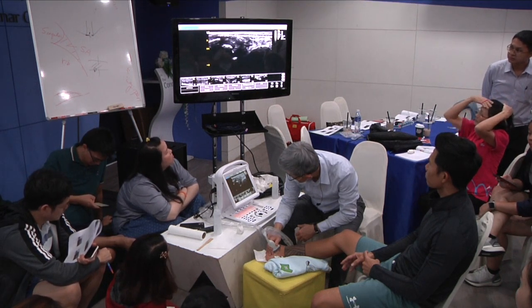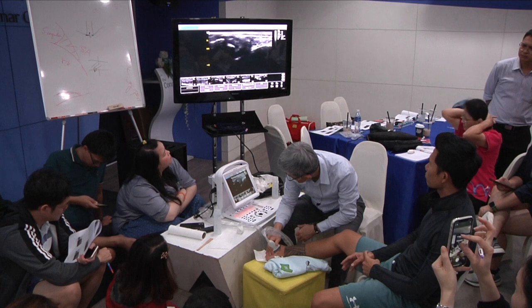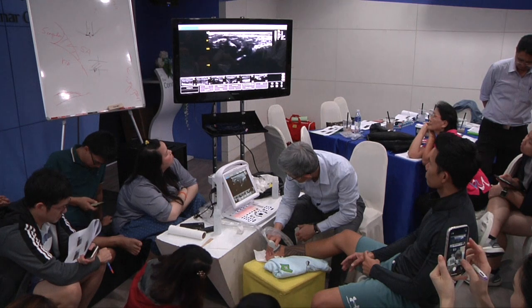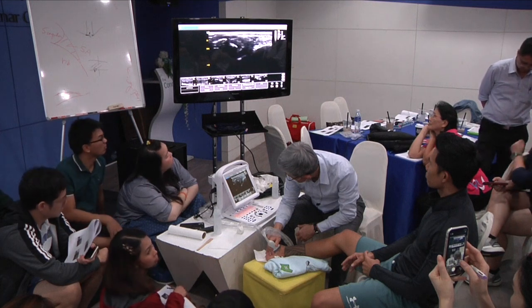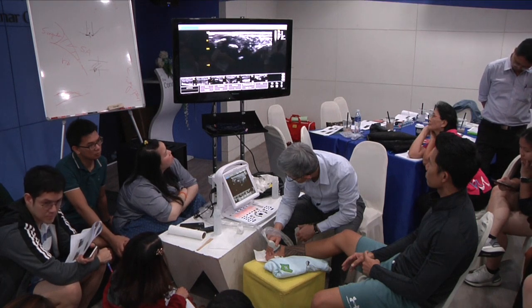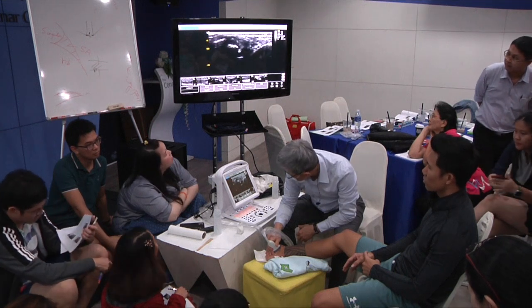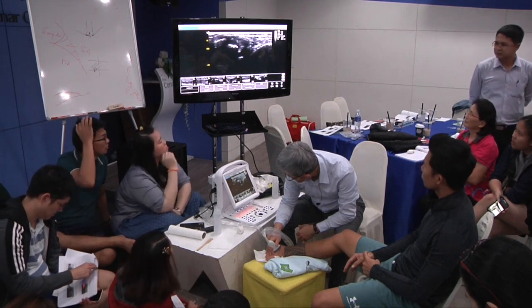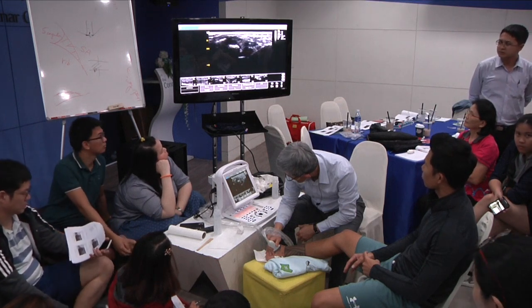The distal is correct. The proximal is incorrect. Why? Did you have a severe medial ankle injury before? No, okay. You may find the shape of the medial malleolus is not very good, right? Okay.